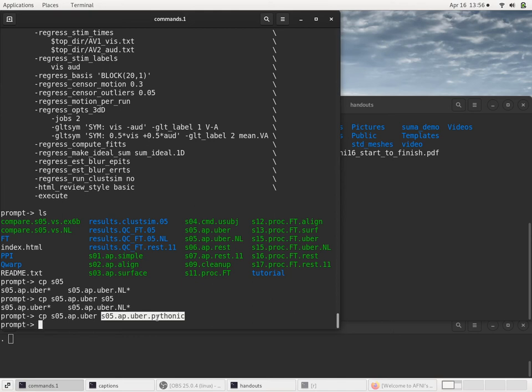So now let's edit this new one, and I guess I'll use afni_open -e if I'm going to actually edit it. That way we can all do the same thing. Whoops, I forgot my -e. If you notice I'm hopping to the beginning and end of line, you can type Control-A to go to the beginning and Control-E to go to the end. That's often very helpful. So I'll edit the script.